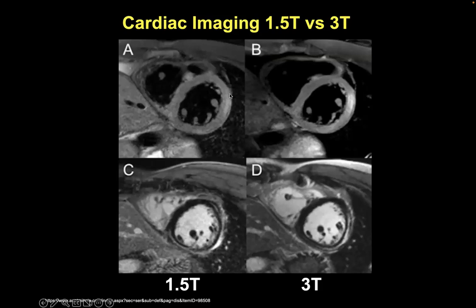And here are the two types of images just directly compared, from one to the other in the same person. And yeah, the image quality is better over here in that there's less noise. See, there's sort of noise hash here. There's less of it over here. Here you can see perhaps better details slightly, but this is, to all intents and purposes, very good for most cardiac imaging, right?